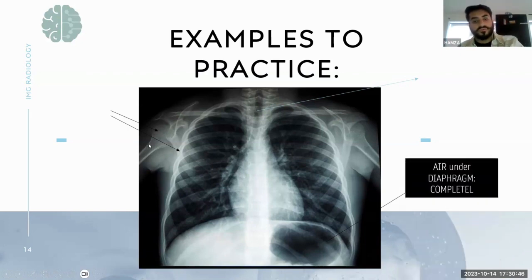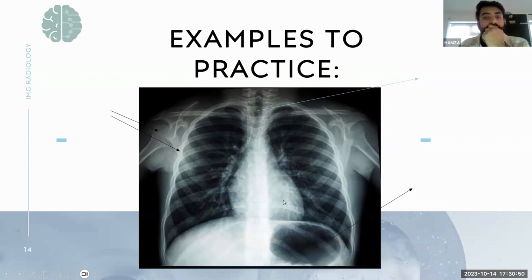The first bit is the trachea. So what do we think that arrow points to? Where the trachea is, why is it black? Does everyone know? It's full of air. Okay. Before we reveal any answers, we'll talk through what we can see on the scan. And the massive bulge at the bottom underneath the diaphragm, why is that black at the moment?